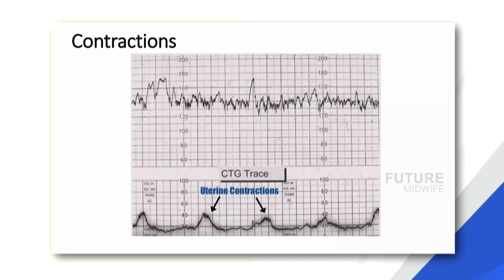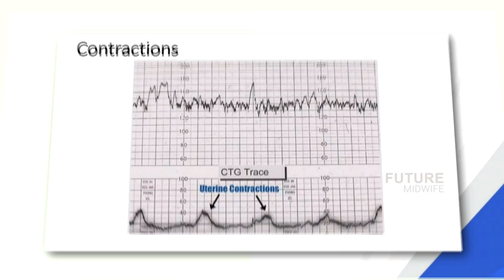At the bottom, there will be readings for the uterine contraction: 20, 40, 60 like that. It is measured in mmHg. So here the mother is getting uterine contraction up to 40 mmHg. That means the mother is getting mild to moderate uterine contraction. So in this strip, the mother is getting around 4 uterine contractions.